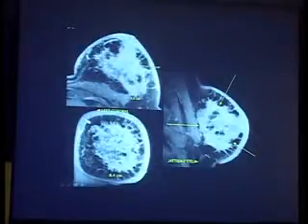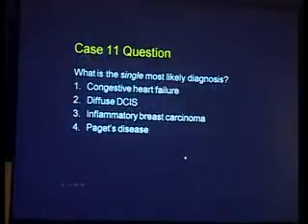These are source images. I just want to show you that you can do coronal reconstructions. But if there's one thing that strikes you in this case, what is that? I heard someone said skin. Is that thickened? How thick is thick? That's thick, right? Okay, someone said 2 millimeters yesterday in the MRI talks as being too thick, but this is thick.